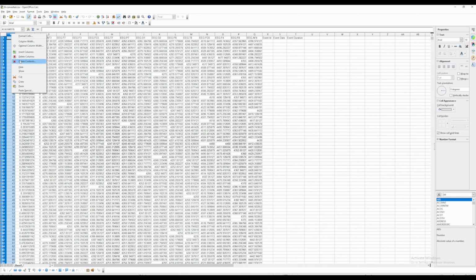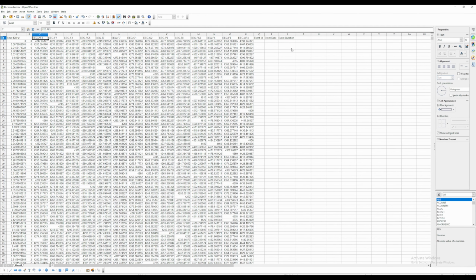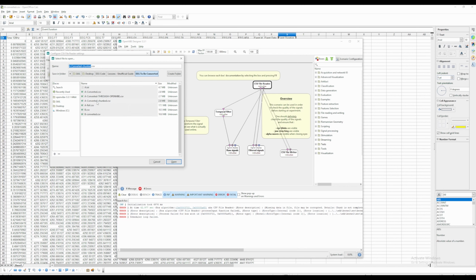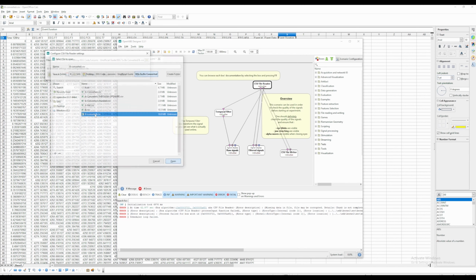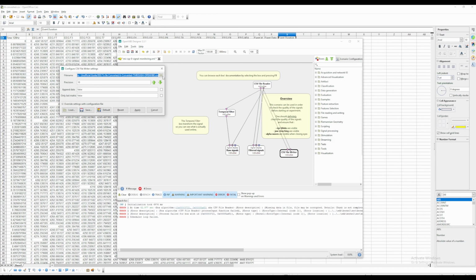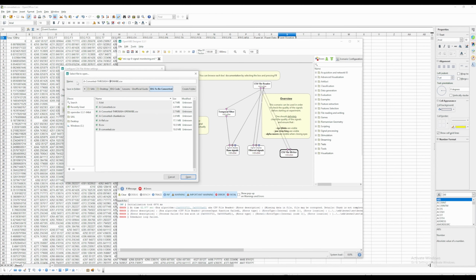So you can just delete it and everything else looks good. Control S, save. And let's open OpenVibe and try our new file out. All right, and let's change the file writer to another one because this is B converted.